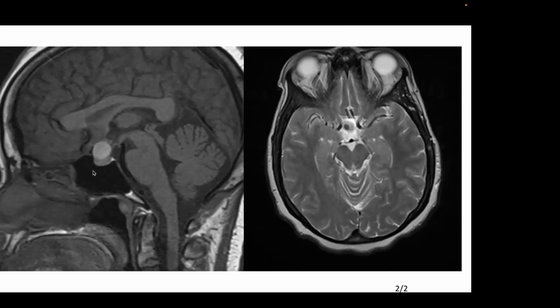Here's the MR scan. Suprasellar mass. Here's the T2 weighted scan. So let's analyze this. Could this be of pituitary origin? Because we know there's an entity of pituitary apoplexy, which will present with headache and can occasionally have subarachnoid blood. Could this be pituitary apoplexy? No. Why? Because the pituitary gland is normal. Exactly. We see the gland. Excellent observation. Right.